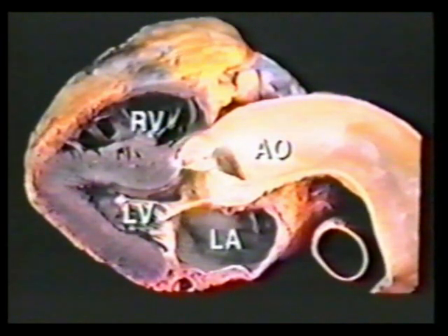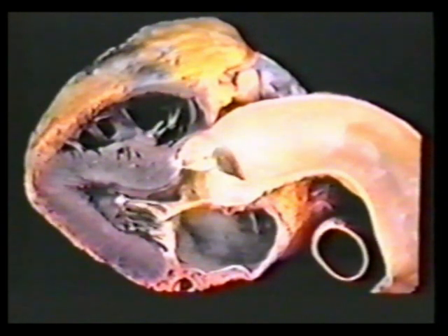Annulo-aortic ectasia is a relatively common condition which results in generalized dilatation of the sinuses of Valsalva and the ascending aorta. The junction between the sinuses and the tubular portion of the aorta is typically effaced. The underlying pathology is cystic medial necrosis. Although a subset of these patients have Marfan syndrome, there are a large number of patients with annulo-aortic ectasia who will have no clinical features of Marfan's.